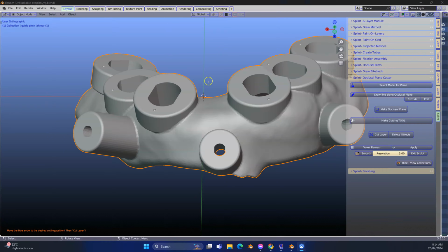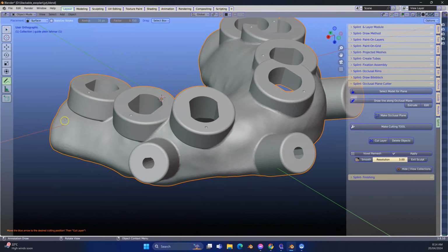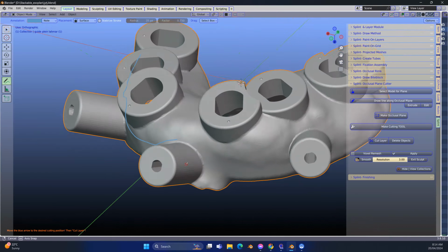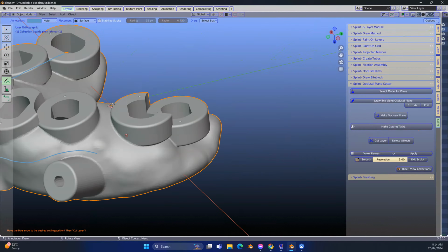So before I engage in this, I will just bring up like a pen, the annotation, and in the tools settings I'll just put this onto surface just to explain. So here what we want to do is cut this along a border like that, and this needs to have enough material as well. So the cutting needs to be done somewhere like this.